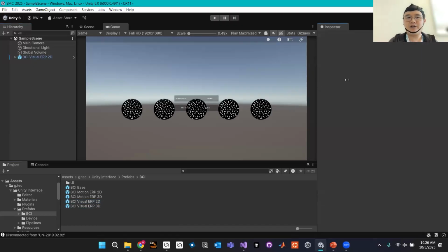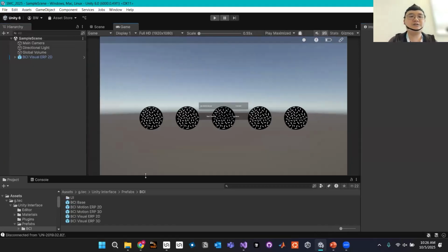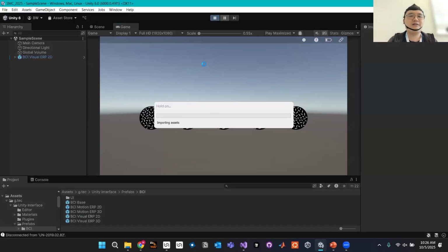You remember, we have already discussed at the beginning that we have different phases: the connection phase, the training phase, and the application phase, right? And we have already managed to build the very first BCI application. So you don't have to do anything if you just want to stop now. The next step, I can show you, is if you click play, then it takes some time to load.